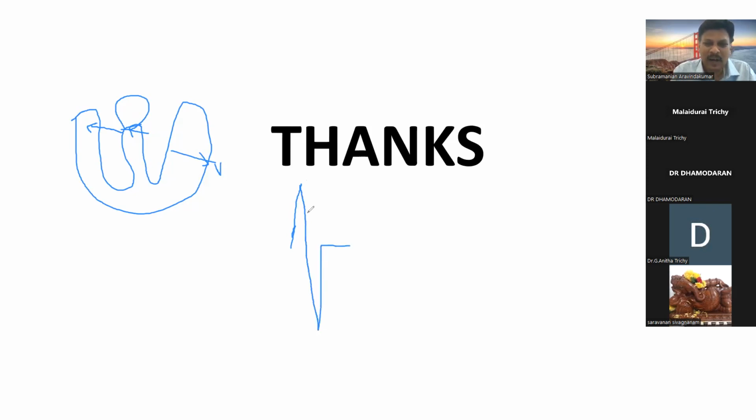So in V3, V4, where there is usually a transition, there will be a very tall R wave and a deep S wave. V5, V6 will be like this, because both the pressures are equal in both the chambers, it will be like V5 R and V1 S. So the height of the R wave will be like V5 and the depth of the S wave will be like V1. At V3, V4, the transition zone where you expect one to decrease and the other to increase, it will not be there.